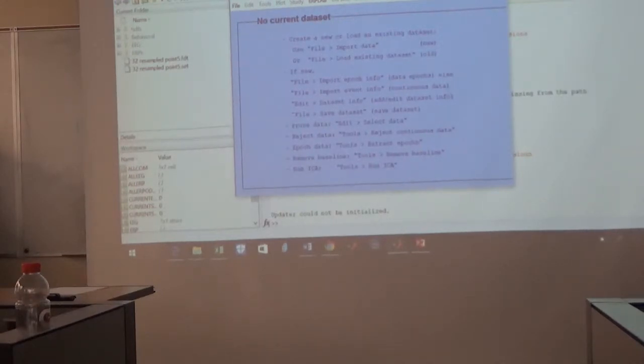Now you should be able to come here, go to add subfolders, navigate back up to there, click that folder, and click done. Okay. There you go, that's it. Then just hit no. For some reason it just doesn't stay, so you have to do that each time you restart MATLAB. It only takes a few seconds.